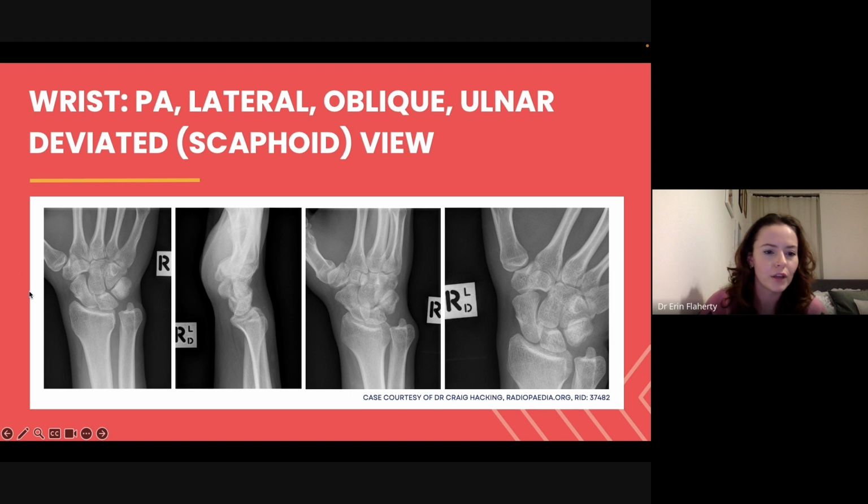There's a mnemonic you can learn to use them, and I have gone over them over and over again, so they're sort of embedded in my head a little bit now, but I still have to think about the T's. So if you go from your radial side, this is your scaphoid, then you have your lunate, and then you have 2 bones here. If you can see with the eye of faith, you have one there and one there. So here you have triquetrum, that's the 3rd one, so 3 tri, and then P pisiform.